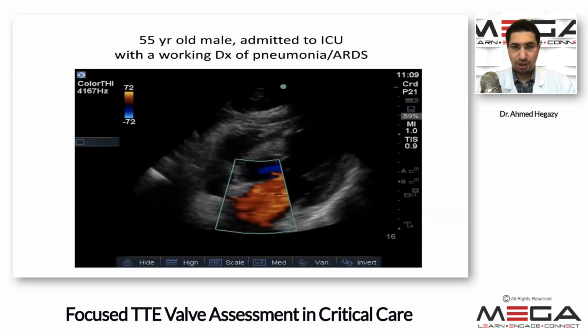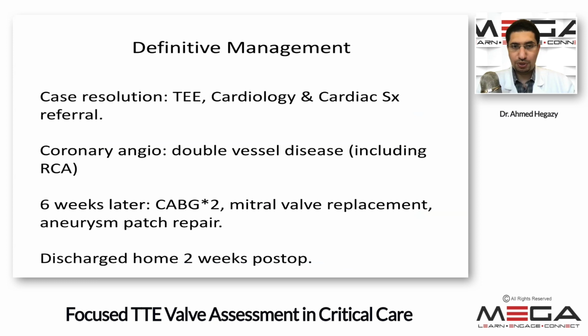And so what we did was we did a transesophageal echo. I put the TEE probe in him, and we confirmed. You tend to get much better resolution because it's higher frequency with TEE. And we confirmed that the patient did indeed have acute severe MR with a normal left atrial size, and that this was a new diagnosis in addition to the inferior basal aneurysm.